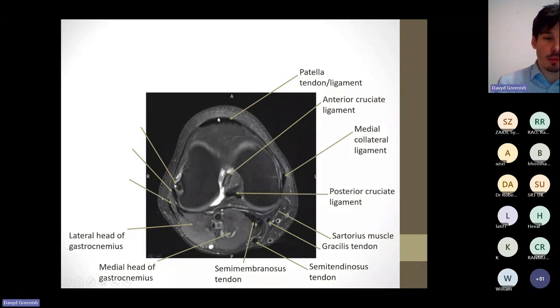Yeah, perfect. So the one sat in the groove here is the popliteus tendon, and that's in the popliteus groove. So that's a lateral structure. So another lateralizing structure. You could use that to identify which is medial and lateral. This is the lateral collateral ligament, or fibular collateral ligament if you want to, and this is just the biceps muscle and tendon coming down there. Very good.